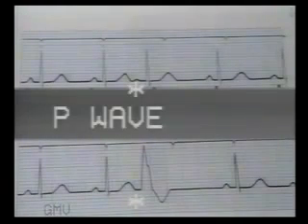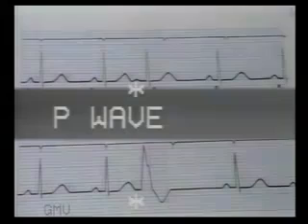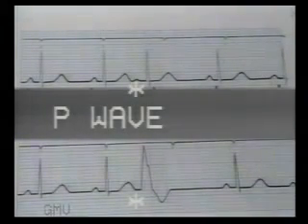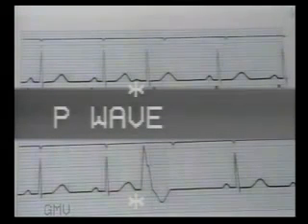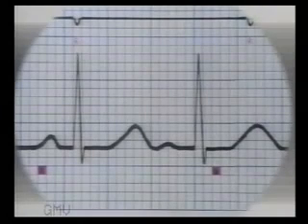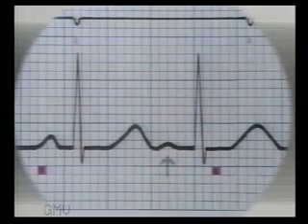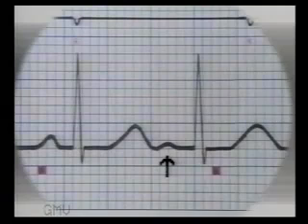Number 3. Ventricular premature beats have no P wave. A preceding P wave is seen only in supraventricular premature beats, though it may not always be visible. It may be merged with the previous T wave. When the QRS complex of the premature beat has normal configuration, the beat is supraventricular. Its site of origin can be determined by studying the P wave. In this premature beat, the P wave is similar but slightly different from the other sinus beats. So this is an atrial premature beat.